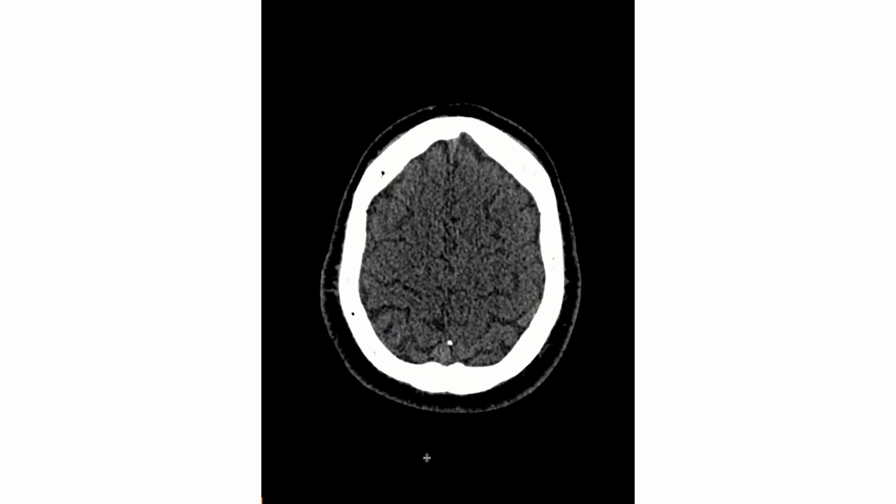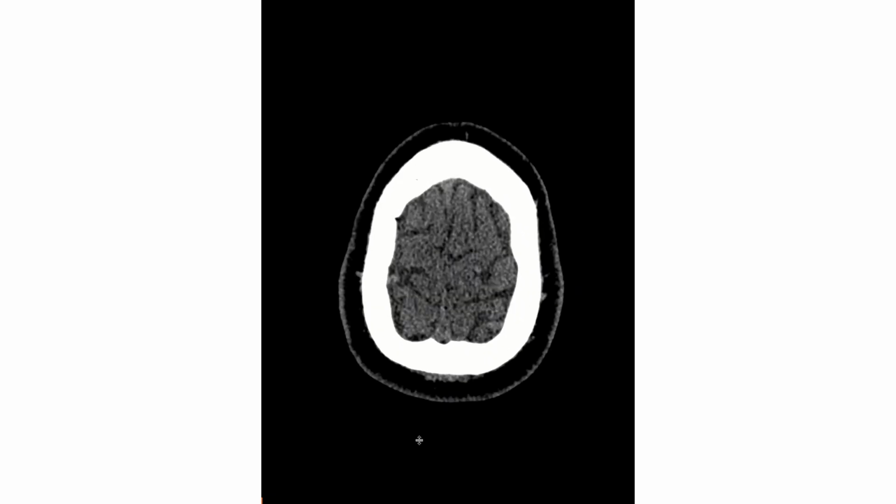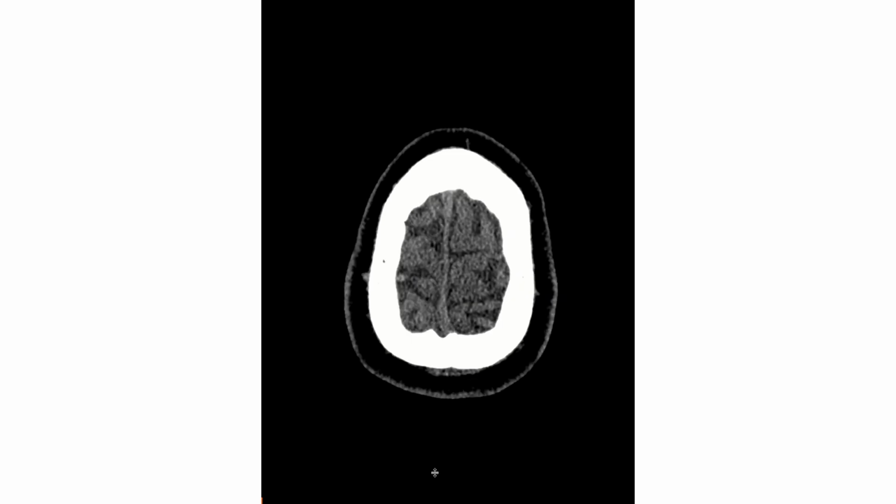So first of all, when I want to look at a head CT, we have to develop a search pattern for ourselves. So either we go from inside out, or you're going from outside in. So this is your preference. If you set your search pattern from the beginning to go from inside out, you just always keep this search format in order not to miss anything, and so that when you get distracted by phone calls or other stuff in the reading room, you're not going to miss your important findings or important structures to be checked. So I usually start by looking at the inside out. So I mean the brain parenchyma first, and then I go to the bone and go to the soft tissues at the end. So this is your preference.